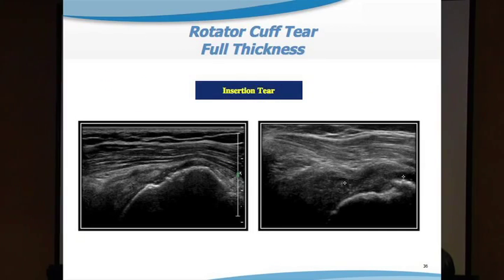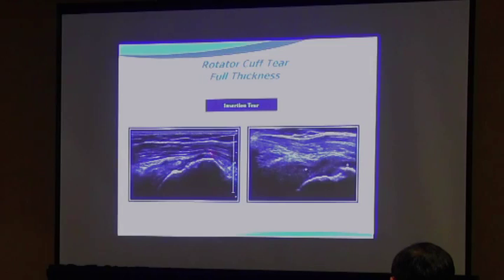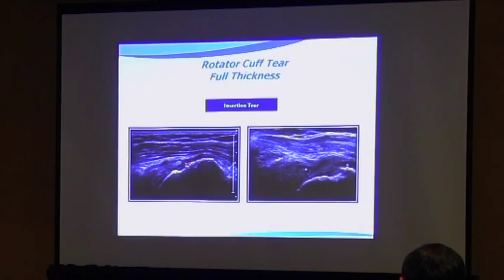Here's where you see some flattening, where the rotator cuff has lost that convex bursal contour. So you have a tear that's torn off, retracted back, and that area of volume loss is taken up by deltoid and bursal tissue that has dropped down into that area of tear.